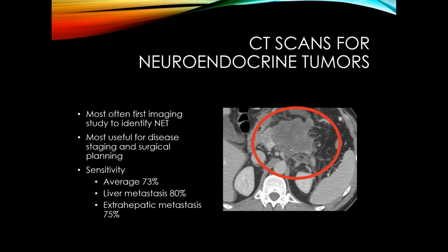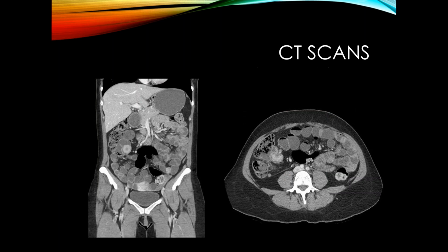So this is the adrenal gland. That adrenal gland is quite close and probably involved by the tumor. This is your kidney, spleen, and liver, and gallbladder. And here's some bowel nearby. So you can see where that tumor is and what it's doing to the other structures. You can also look for distant metastasis. It's excellent for looking for liver metastasis, lymph node metastasis, as well as very useful for the lungs.